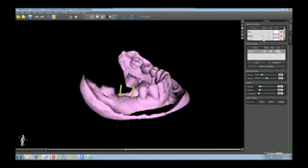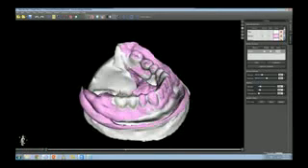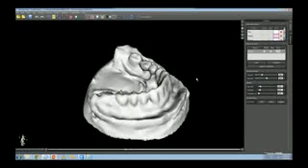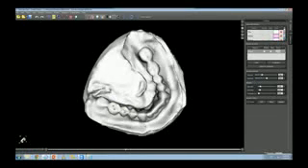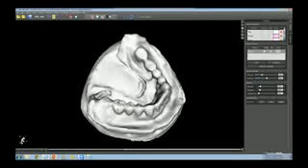But before the prosthodontist resected the pontics from this bridge, I snapped an alginate. So I'm superimposing two models here, one with and one without the pontics. So you can see how that simple alginate gives me future tooth position.